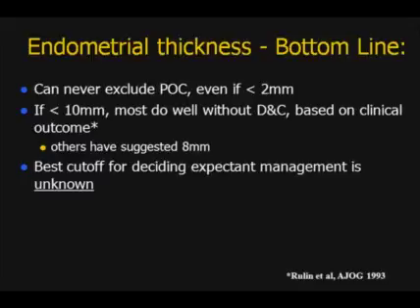If you base it solely on pathologic correlation, you can virtually never exclude retained products of conception. Retained products have been reported on pathology even with a thin endometrium of less than 2 millimeters.